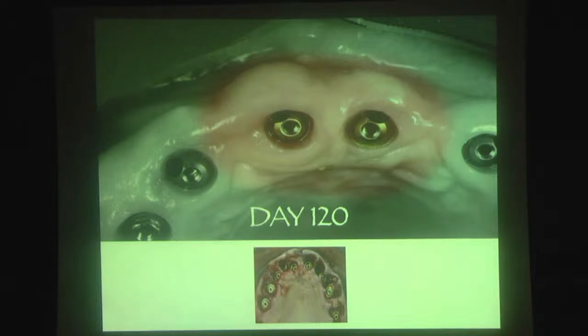Okay, it happened on day 120, that means 4 months later. In those 4 months, I did nothing. I just made the sites stable and left them in a secondary healing process, put the immediate temporary prosthesis on top, and did nothing. The biology worked, and now a very good view.